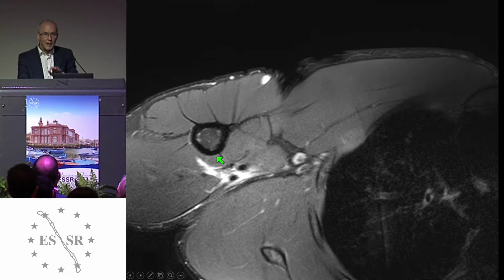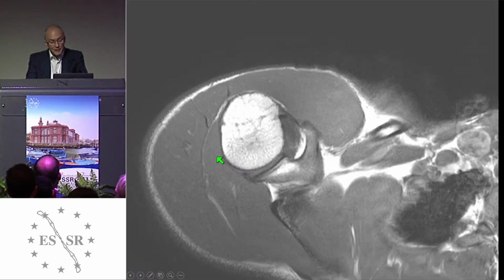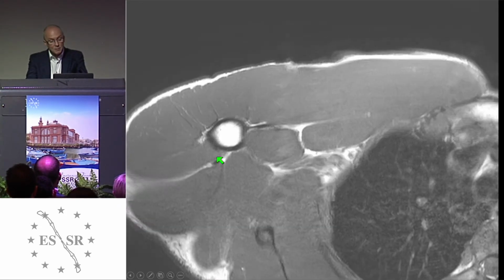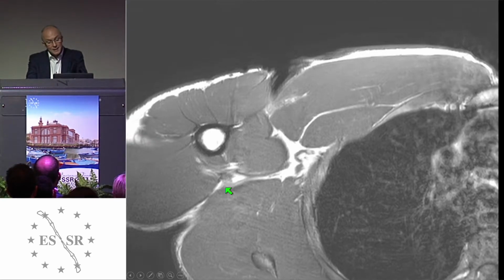But you see this is quite far away from the normal field of view you have on your standard shoulder protocols, and that makes the difficulties with this diagnosis, I believe. This is the T1 weighted. We can go through these images more quickly, but you see again the insertion site with the pectoralis major, and here you see the quadrilateral space at this site.